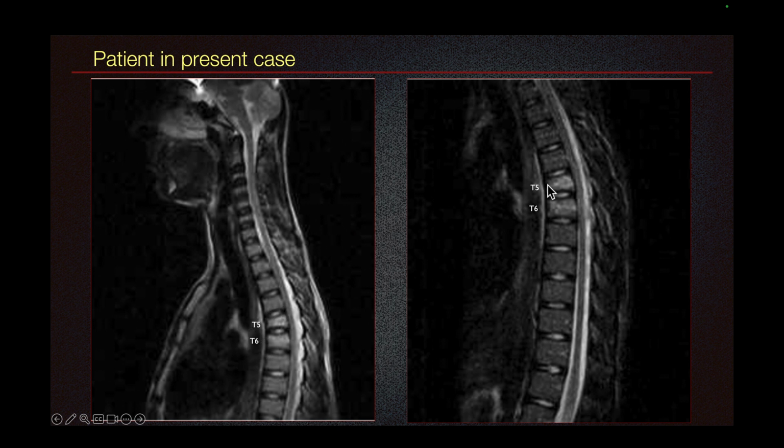There is edema signal in T5 and T6 vertebral bodies, and when we compare these vertebral bodies to the T4 vertebral body, we can see that they have slight height loss. As we go from top to bottom in spine, the vertebral bodies should have similar or slightly increased size as we go below. So this patient has compression fracture of T5 and T6 vertebral bodies.